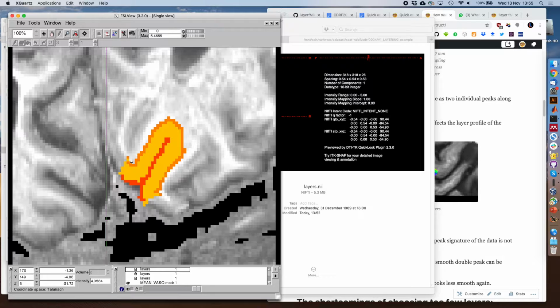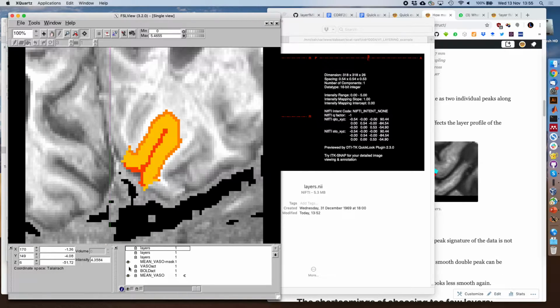Yeah. And the layerification or layer definition, you do it after processing the data, like with the T map, or in the pre-processing or post-processing step? Right. I never really understood the difference between pre and post. I usually do it in EPI, so I need to have some mean EPI image like the one we are looking at right now.